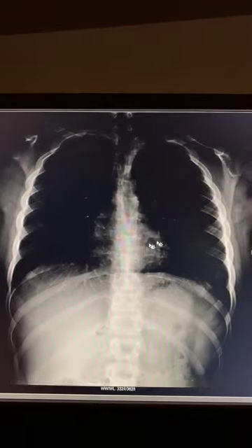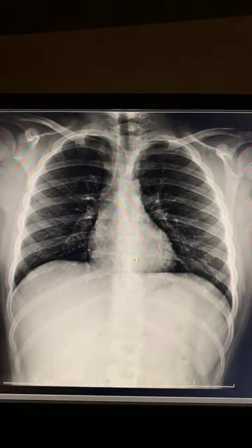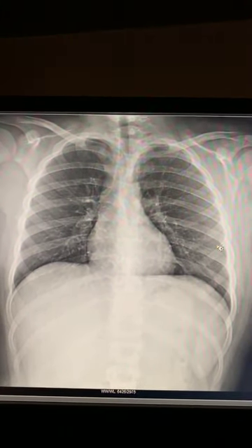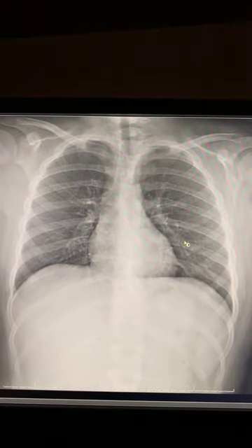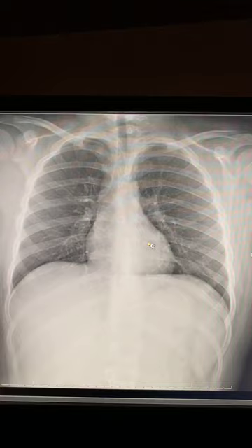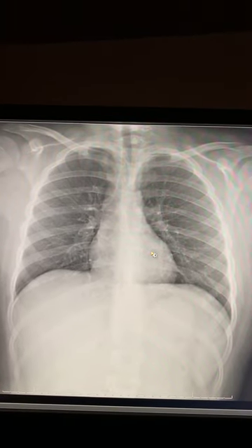Do you know how many times on a chest X-ray I've zoomed in, windowed accordingly to the vertebral bodies, and caught some sort of irregularity that I recommended additional imaging for, and it actually ended up being osteomyelitis? That can happen. That's not something that happens every single day, but I promise you, you'll look like a superstar if you find it, all right?